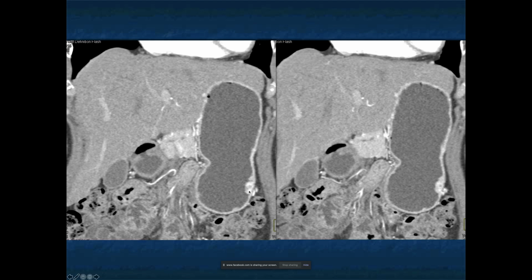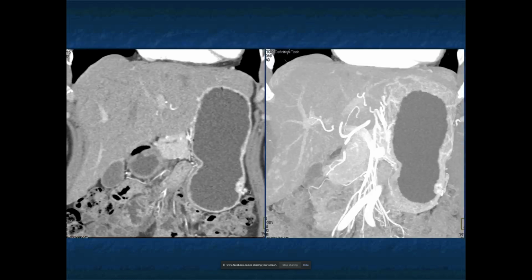If you had a lot of lesions, you could say, and I showed a case a couple weeks ago in conference, a patient with Zollinger-Ellison, with MEN syndrome, where the patients have gastrinomas, and you have all of these hyperplastic polyps or tumors, multiple gastrinomas in the stomach, but here's a solitary lesion. So what can give you a solitary vascular lesion in the stomach?